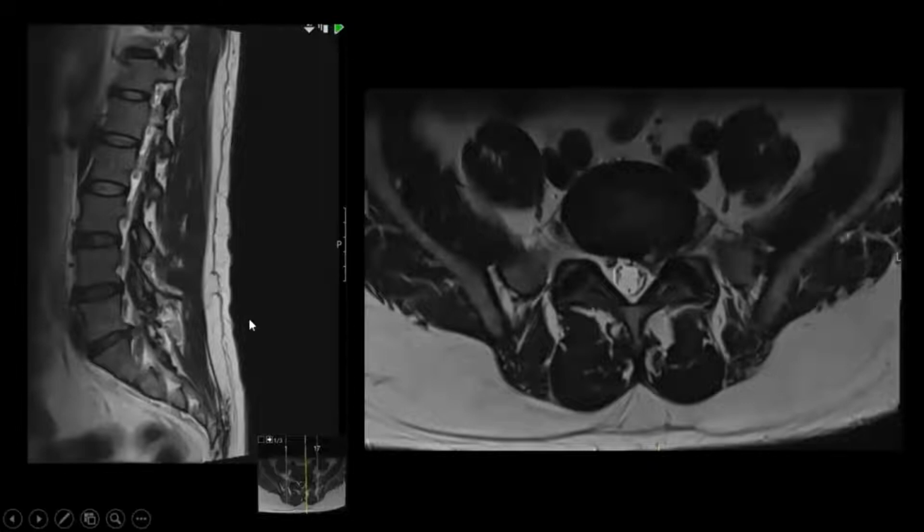Moving on to another case, you can see there's another disc protrusion, likely with a disc osteophyte complex. You can see the end plate pointing posteriorly. You can see that the right exiting nerve root is fine. The left exiting nerve root appears to be impinged on by the disc. So the left exiting nerve root at L5-S1, so this is the L5 nerve root, has been impinged. What you can see is that the disc osteophyte complex is causing compression of the traversing or descending S1 nerve root. So the right S1 nerve root appears normal. The left S1 nerve root is being compressed along the lateral recess.